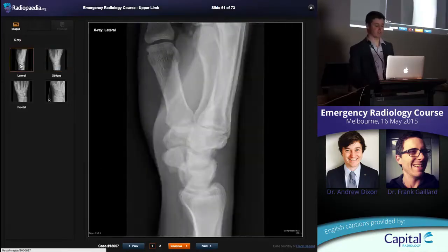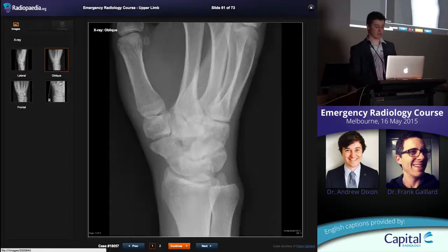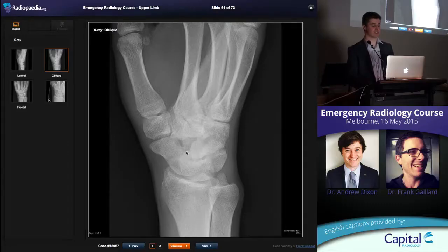We're moving on to scaphoid fractures now. Scaphoid fractures, as you all know, are very important because if you fracture through the waist of the scaphoid, the blood supply typically comes in through this junction between the waist and the distal pole and supplies the proximal pole of the bone. If you fracture through the waist and you do it with significant displacement, then that can disrupt the blood supply. That proximal pole of the bone becomes devascularized and you get avascular necrosis in there.